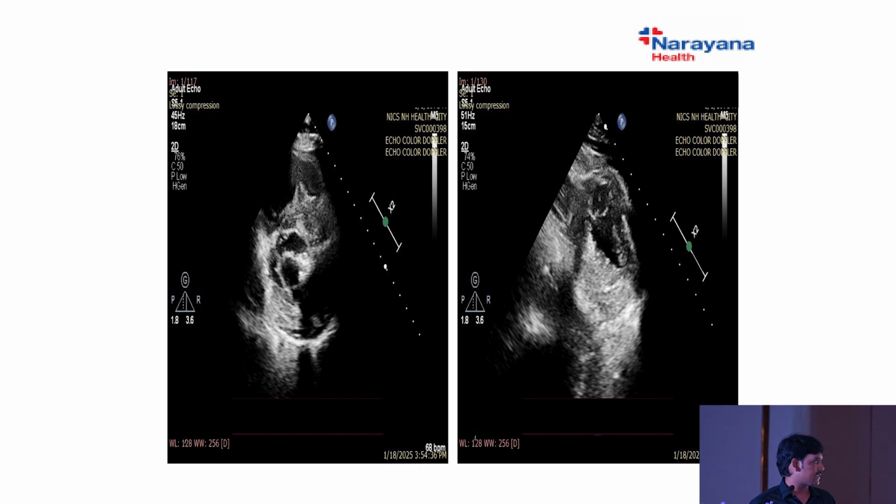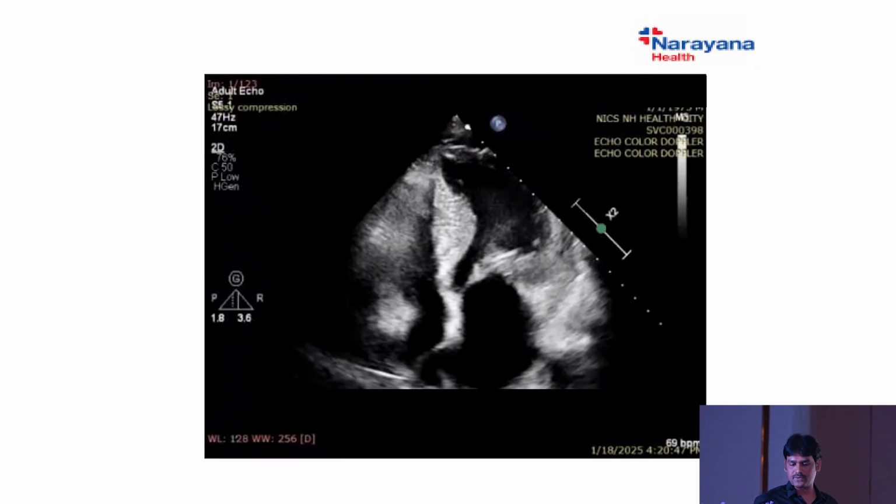In the parasternal short axis views at different levels, the mitral valve showed a densely calcified lateral commissure, while the medial commissure was free from calcium, and there was no commissural fusion. The papillary muscles were hypertrophied, with a suspected accessory papillary muscle at this level.